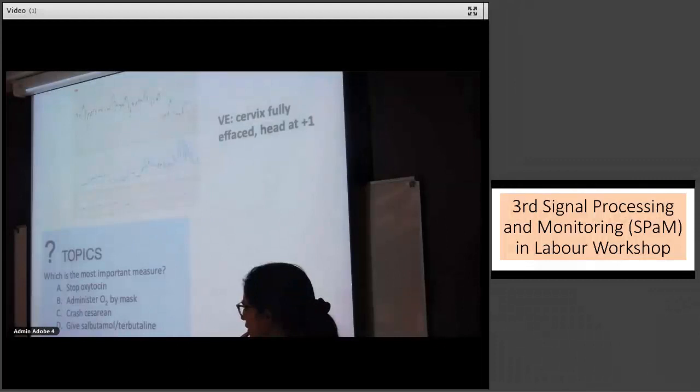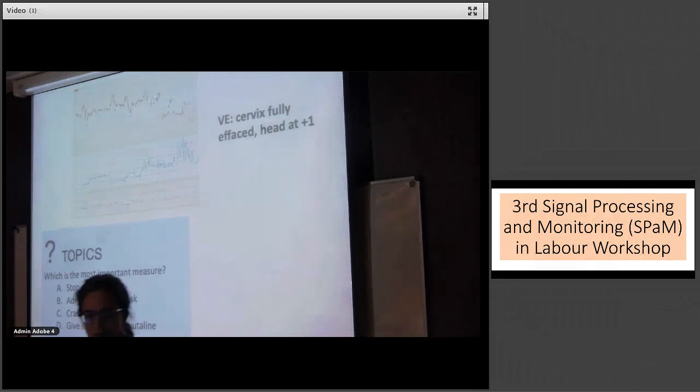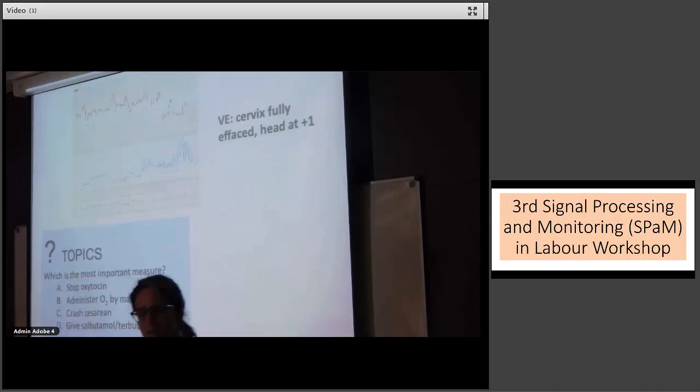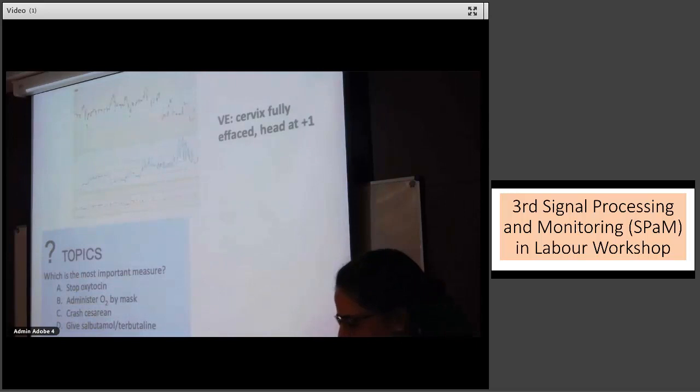Thank you, Dirk. So you would manage this as an acute event here and try to reverse it. Okay, fine. Thank you. Anna, please. What do you think is happening? With the limitation that contractions are not being picked up properly, do you think the mother is contracting too much, or the baby is not tolerating rather normal contractions as you would expect?